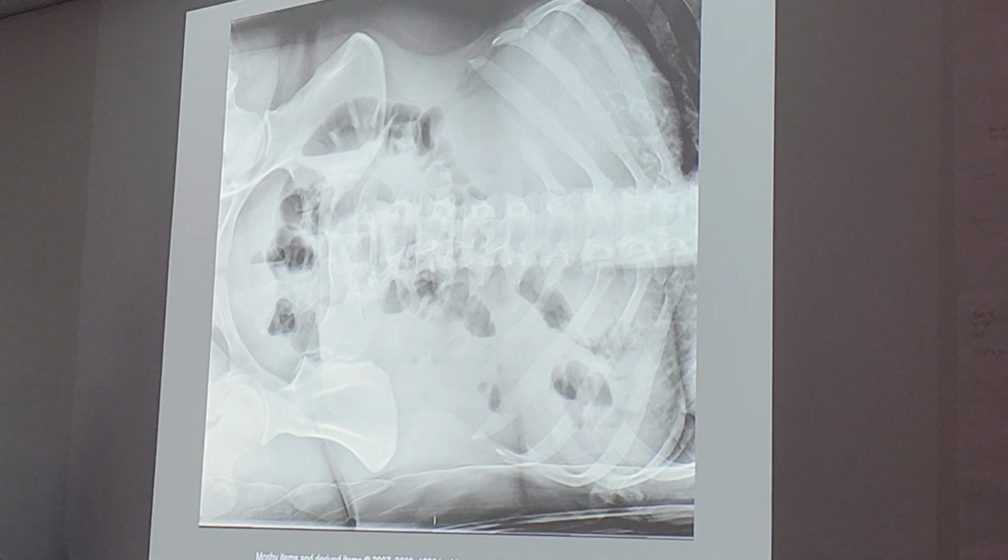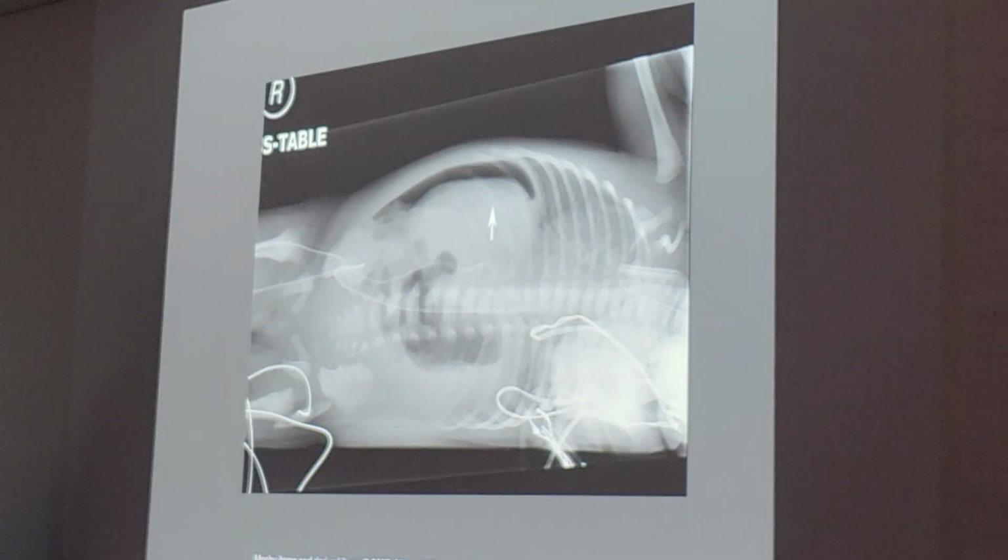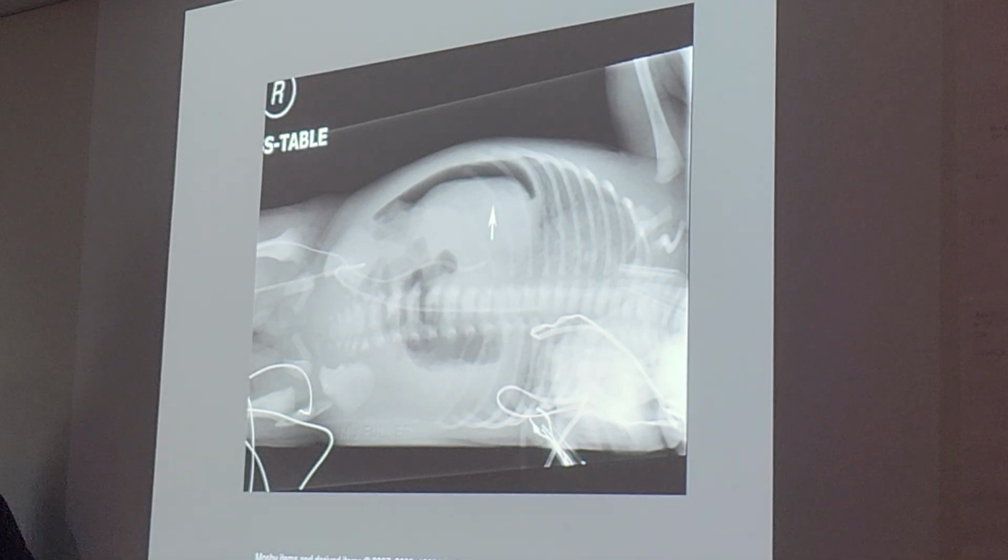You see it on both sides usually, but on this one I can only see the one on the right. And this one? Baby again. It's a baby, okay. Talk about positioning. Oh, you can see the legs. So it is decubed.